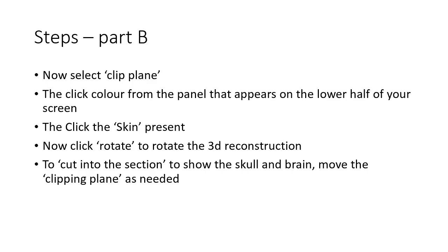But before I started clipping, if you look at the bottom of the screen, there is an option saying color, and if you click that tab, you will see various presets of the settings, and I chose the skin setting, and that gave the reconstruction the appearance of the skin.